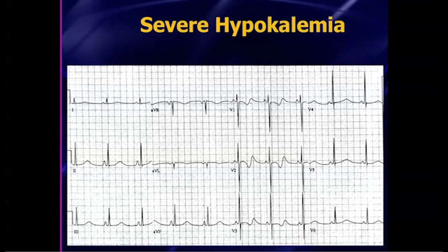This patient's potassium, as I recall, was about 1.9. This is a fairly pronounced case. T-wave drops down, and then a big U-wave jumps up into the sky. Biphasic T-wave pattern, but it's a reverse of Wellens in those mid-precordial leads. And then out here in the limb leads, you just see a long QT.